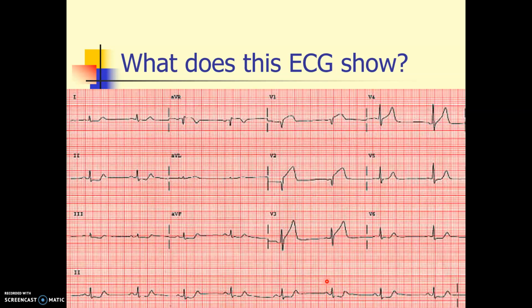Right, let's look at some ECGs. So these are all patients who have come in with acute coronary syndromes: shortness of breath, chest pain, diaphoresis, syncope. Look at this guy. He comes in, and this is his initial ECG. Well, you see primary ST elevation in V1 and V2 certainly, and then some suggestion in V3, possibly V4.